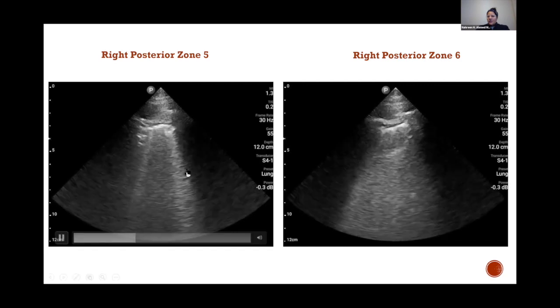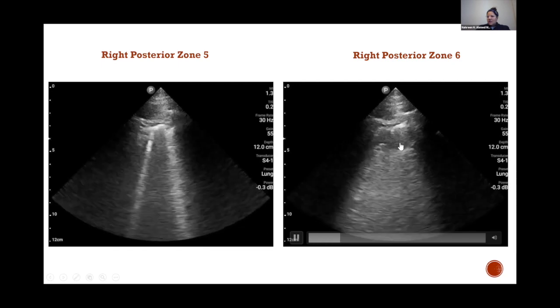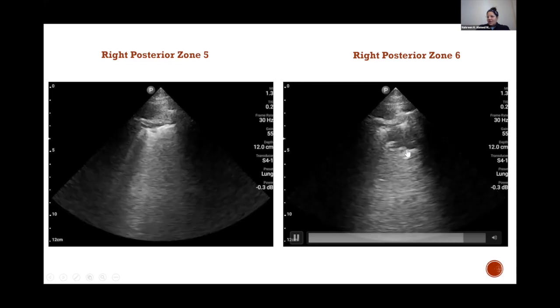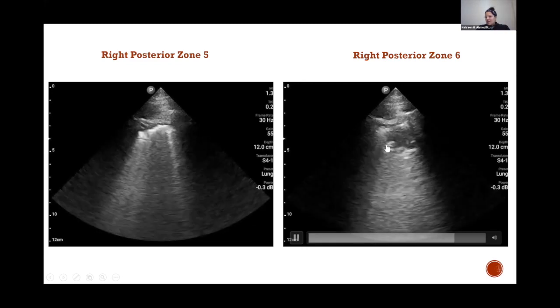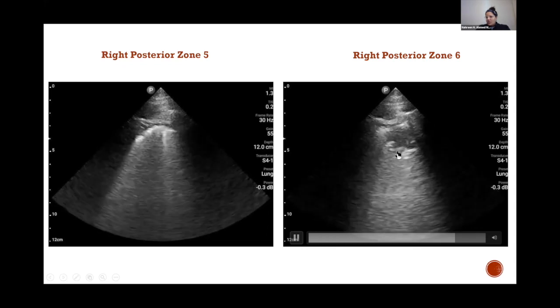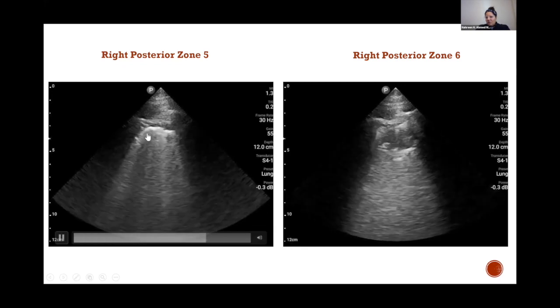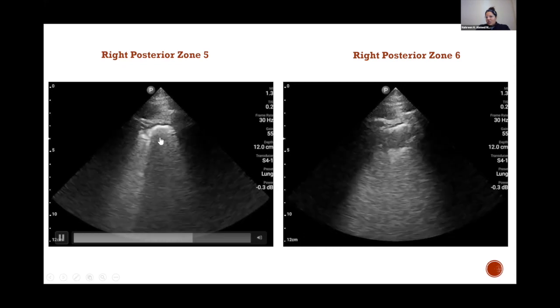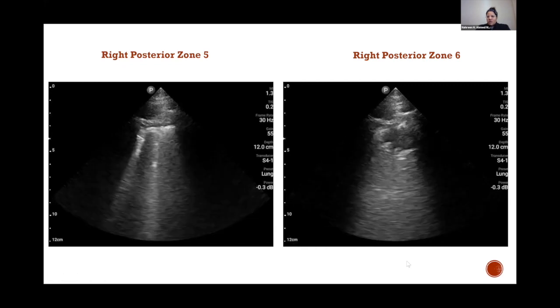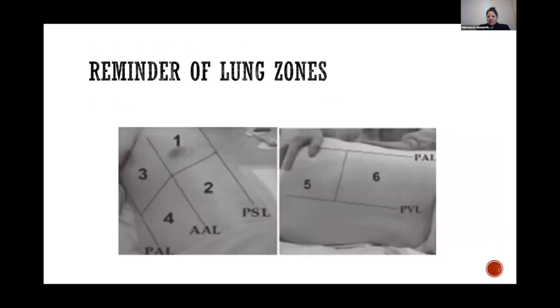The next question was about consolidation. There are two big types of consolidation. One that you're seeing here is what's called subpleural consolidation. It's right below the pleura. Pretty much everything is technically right below the pleura, but this area that you see here that's white is subpleural consolidation. Here too, you see it at the base of the pleura. You see these small little blips in the pleural line. Those are all subpleural consolidations, versus the patient who has larger consolidations that you might be seeing at the lung base. I'm going to just scroll back to answer that question.